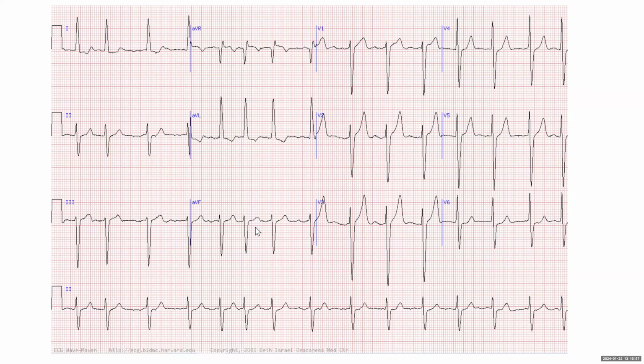Yeah? Good. Excellent. Any question about this ECG? No? Good. Okay.